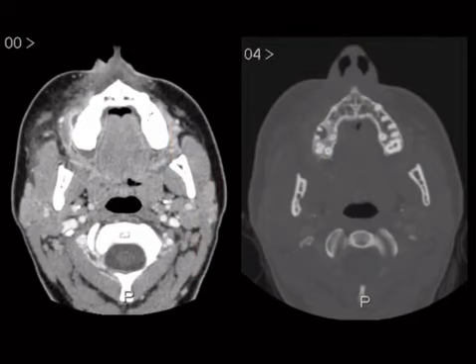All right, another case. This is another odontogenic situation, and this right here alone you may not pick up, but when they show it on the bone window, so bone windows in the head are going to be shown for a couple of reasons. One, to show you lucencies and stuff in the teeth. Two, to show you fractures in a trauma situation. And three, to show you aggressive osseous lesions, which should be obvious. So when centered over the teeth, immediately look at the teeth because that's what they're going for.